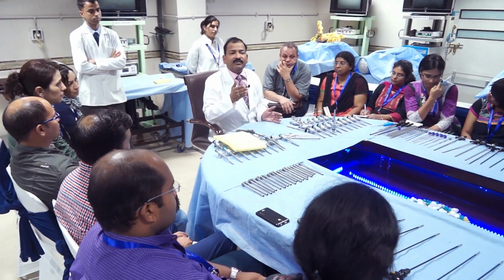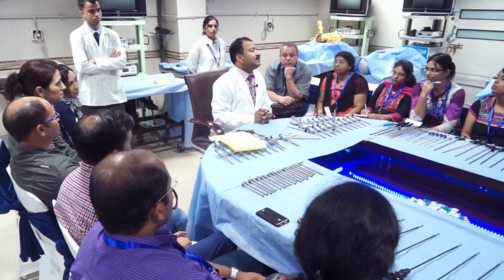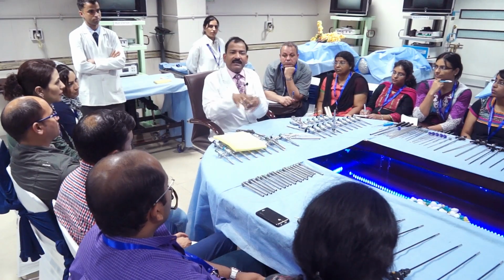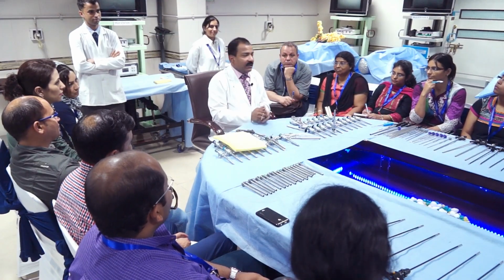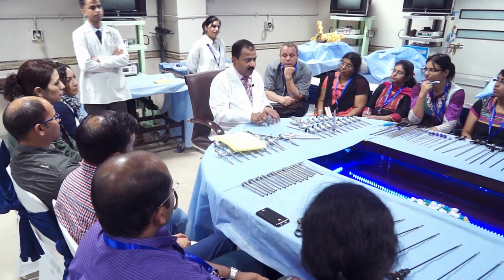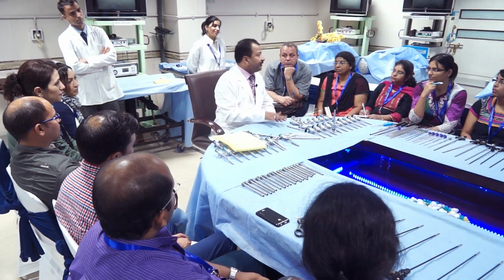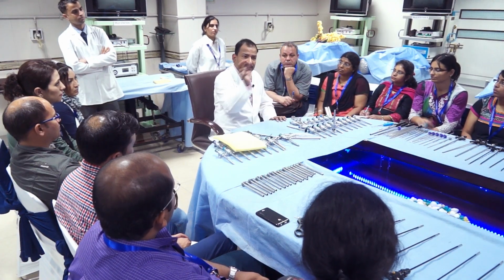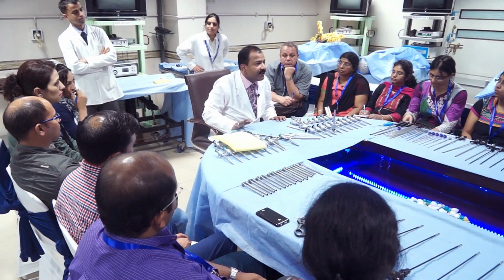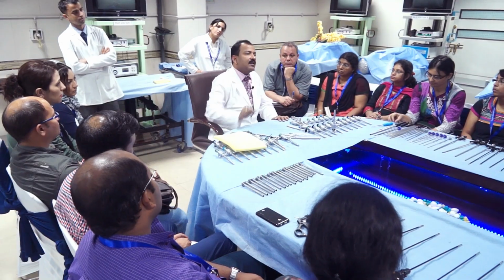Just like sometimes what we do, we learn laparoscopy by seeing YouTube videos. Unfortunately, those are edited videos. Wherever there is bleeding, we cut that area and paste it. And do you know how those videos are? A, B, C, D, E, F, L, M, N, O, P, X, Y, Z, and all the letters are missing. And we think those missing letters we do not put in our surgery, and then complication and accident are waiting to happen. So those videos are useless to learn laparoscopy.